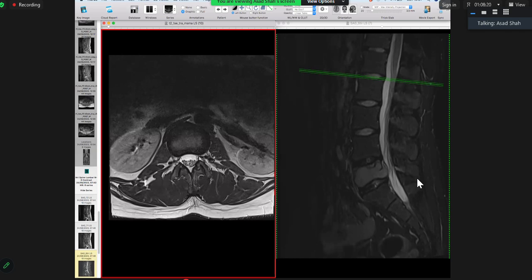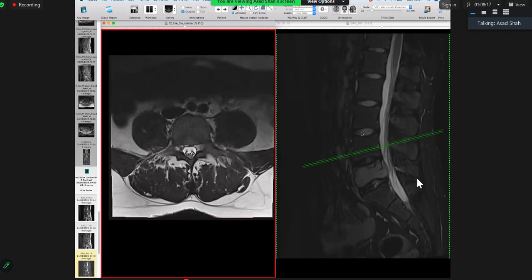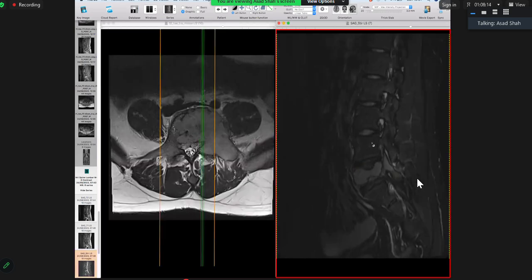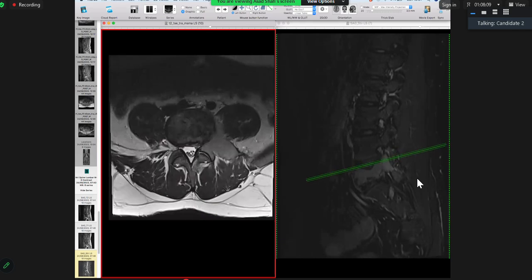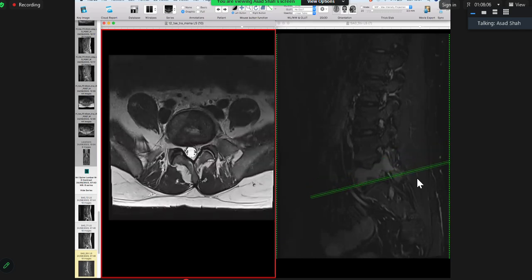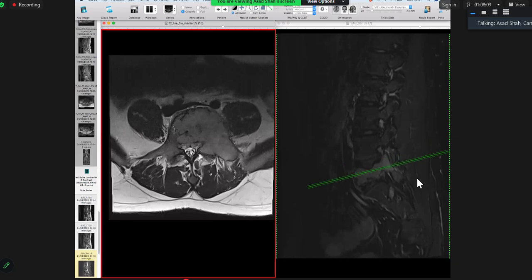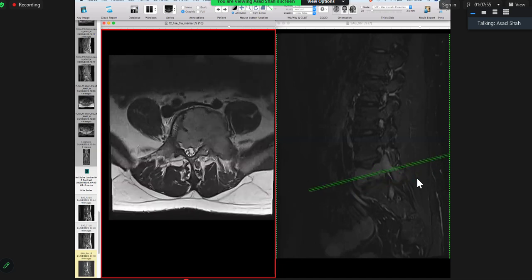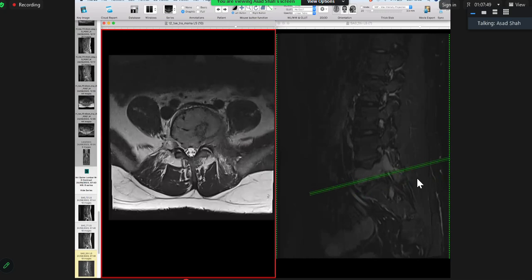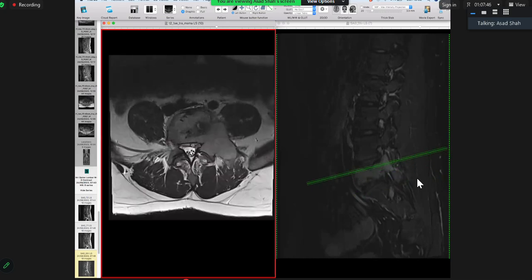Chest radiograph is normal. So for the differential, you said metastases. If I say it's a primary bone tumor, which primary bone tumor can affect the vertebral body like that? Aneurysmal bone cyst? Well, do you see any fluid levels on the T2 weighted? No, I couldn't see any. Chondroblastoma? So this T2 signal, is it bright T2 or low T2? It is slightly low as compared to normal CSF. Right. So what does that imply? Can you be a bit more clever and give a more pertinent differential diagnosis? In addition to metastasis, it's a primary bone tumor.